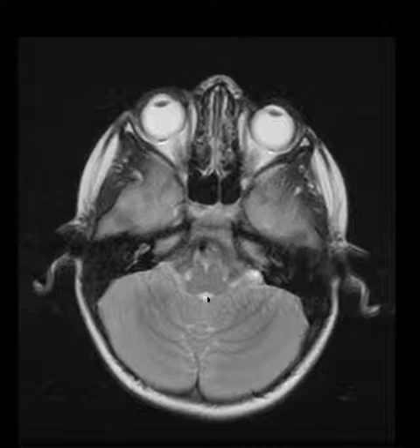And from the very bottom of the fourth ventricle, you see some CSF fluid signal on either side. This represents the lateral aperture, sometimes known as the foramen of Luschka. The lateral aperture is best seen in the axial image, whereas the median aperture is best seen on the sagittal image.